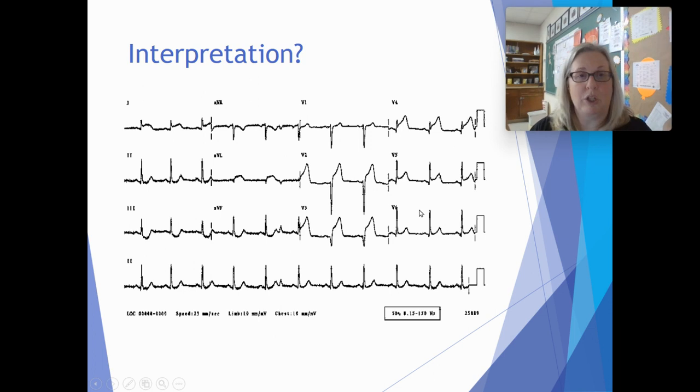So what do we do with this one? Number one, we need to take troponins, right? Troponins for sure. We could do potassium if we wanted to, but I'm pretty sure the peaked T is not potassium. This is heart related as far as STEMI goes. It also depends on their signs and symptoms. But troponin levels most likely go straight to the cath lab, especially if those troponin levels are high. Okay? All right. How'd you do? Let's try the next one.